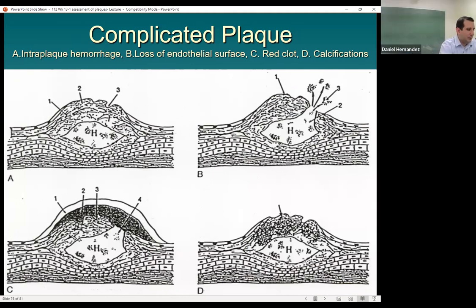Okay. So remember you said that sometimes you could develop blood clot on top of areas that are ulcerated with some of these hemorrhagic plaques. So this would be developing some clot on top of that area, and then it gets sealed off with this fibrous layer. If it doesn't seal off, that thrombus could potentially embolize as well. Here you're getting some of that thrombus formation on top of it.